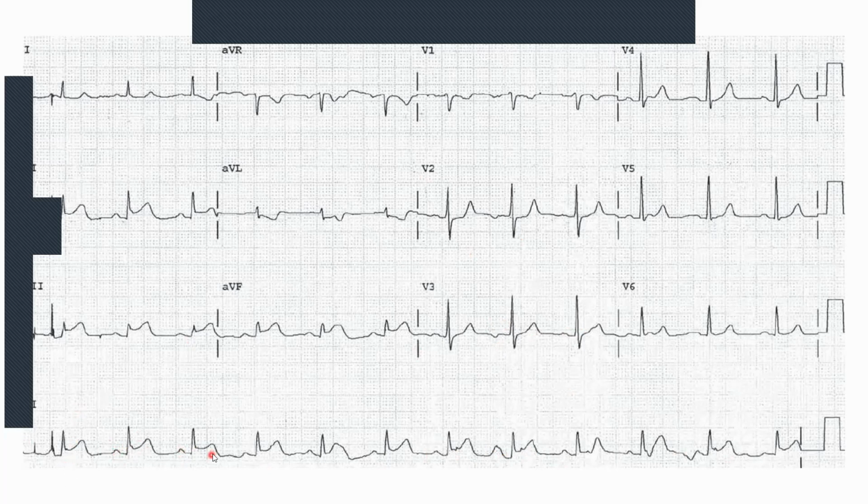And here we can see we've got narrow QRS complexes. We've got a QRS following every P from what we can see over there. There's just the one anomalous one here. And then they are relatively regular. So here I suspect there may have been some patient movement or something that may have led to that. And that could be the reason why we have that anomalous one. And here we have a biphasing, so it could have just been a bit of patient movement on the rhythm strip as well.